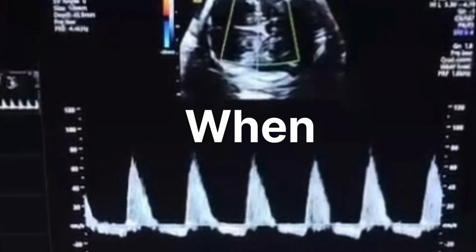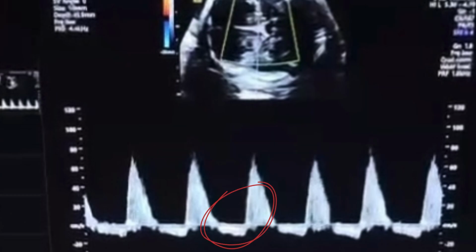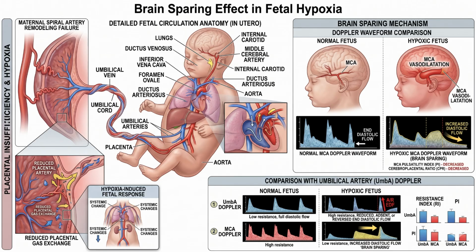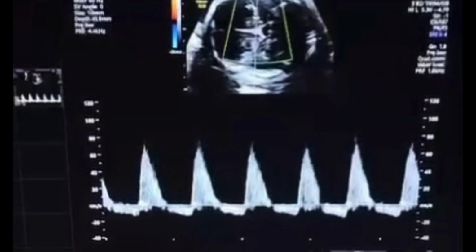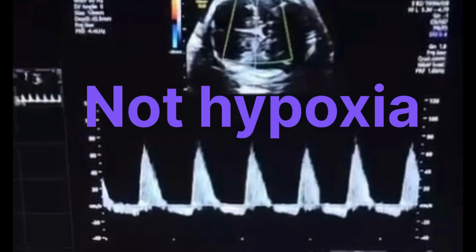So, when do we see true pathological reverse diastolic flow? Interestingly, typical fetal hypoxia does not usually cause reverse diastolic flow in the MCA. Instead, fetal hypoxia classically produces the brain sparing effect. The cerebral vessels undergo vasodilatation, cerebral vascular resistance decreases, and the MCA diastolic flow actually increases. So, seeing reverse diastolic flow in the MCA does not automatically mean fetal hypoxia.